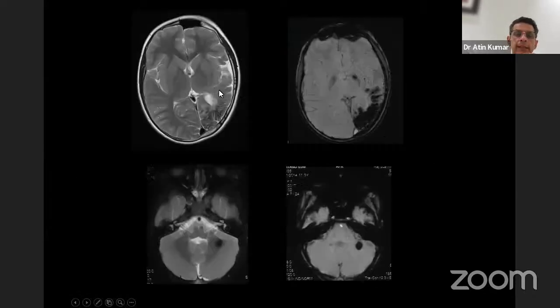So another example, in this case, the T2 weighted image, ventricles are showing bright signal, and shows some dark areas here. Query bleed, was it bleed? We did a susceptibility weighted imaging. We know now that it is a bleed because it is appearing significantly dark.